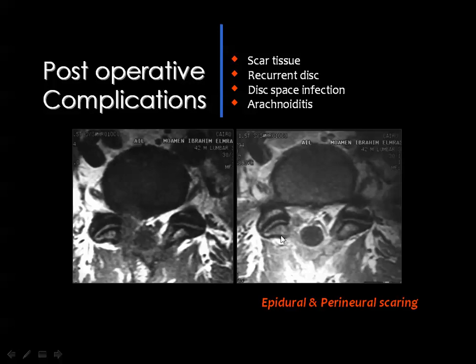And you see that there is a spinal laminectomy with the thecal sac decompressed, sagging through the laminectomy defect. Actually, within the enhancing scar tissue, you will identify the nerve root. And this is, of course, the nerve root, because on the opposite side, you have the corresponding nerve root. And you should know also that the nerve root which is entrapped within the fibrous scar will not look similar to the normal nerve root. It will be swollen and may show some contrast enhancement.